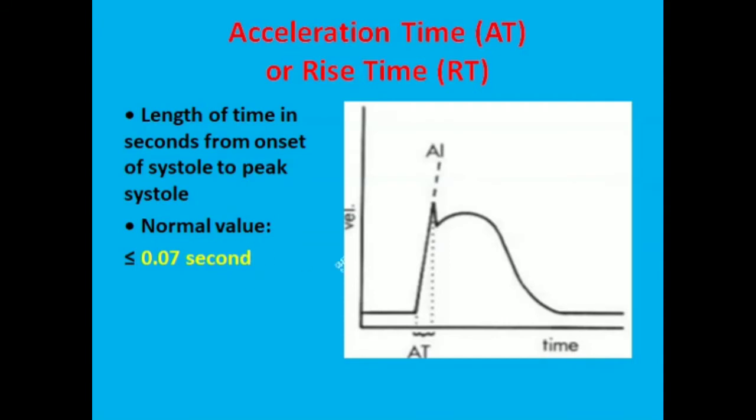This image shows that here the acceleration is started. The time taken from here to reach the peak is called acceleration time. The acceleration time or rise time should be less than 0.07 second.